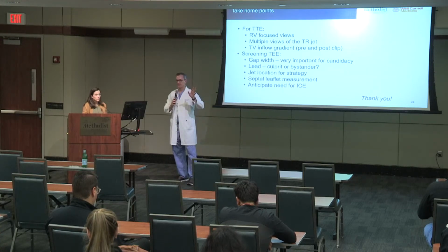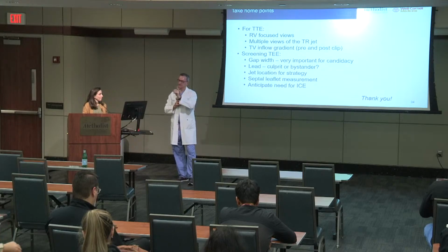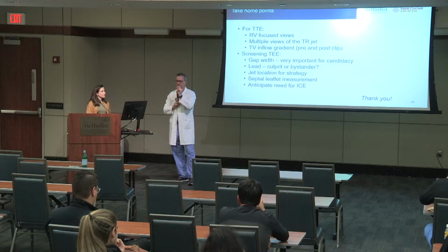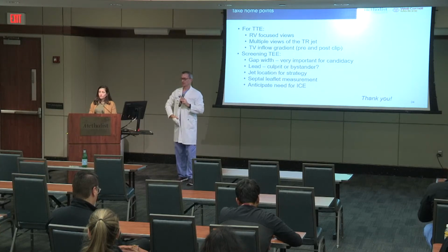So when you have a bad shadow, often left-sided prosthetic material, or just sometimes bad luck with a horizontal heart and things are far away, ICE is fundamentally looking from a different location. Some of it is the frequency, but some of it is just the advantage of not having to look through the same things and being much closer. So the follow-up question is, why not just use ICE?